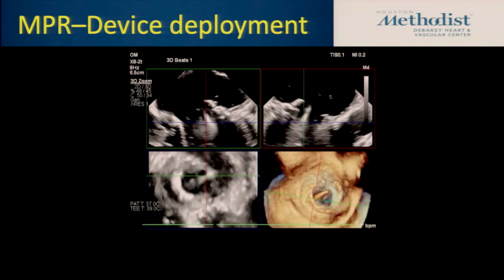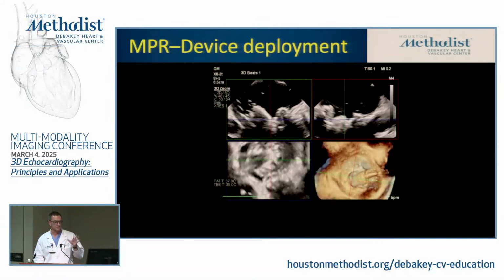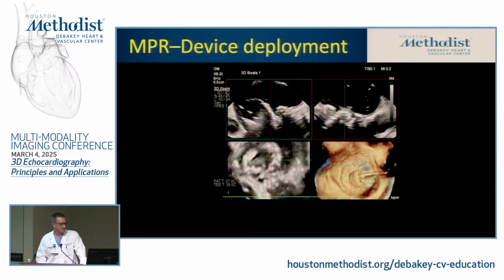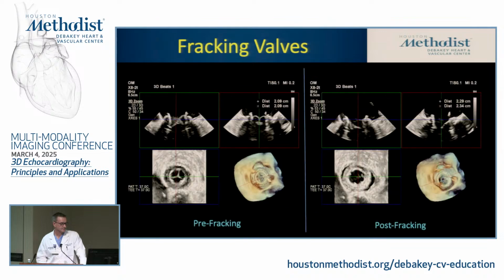It doesn't always look this good. There are times that the 2D is just okay, and the 3D is going to be just okay. It doesn't always look this good, but this was a particularly decent one and worthy of presentation. And this is an application of how we used it.